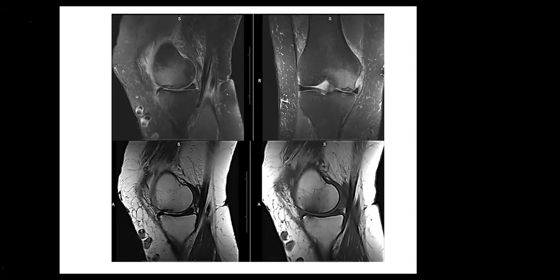Osteochondritis dissecans. There is only edema, and this is not detached and not displaced. But here the bone intensity looks normal. There is no abnormal trabeculation like that seen on the X-ray. There is no soft tissue swelling, no joint effusion.